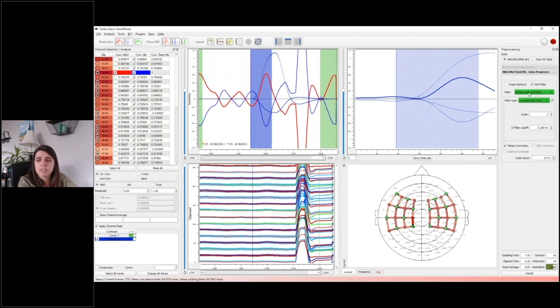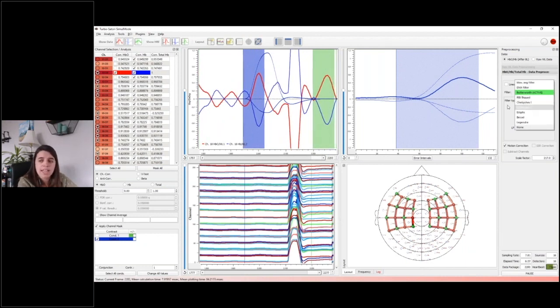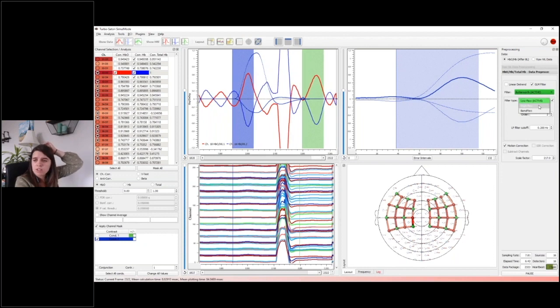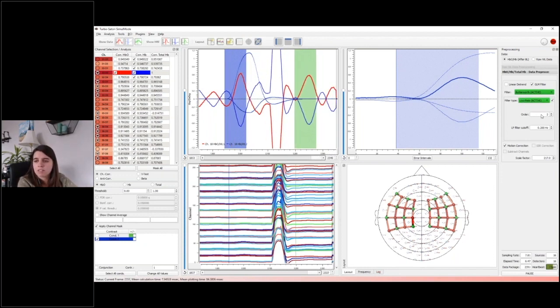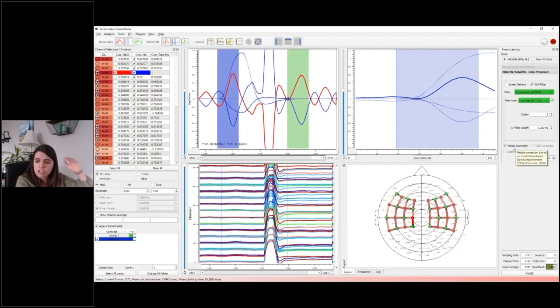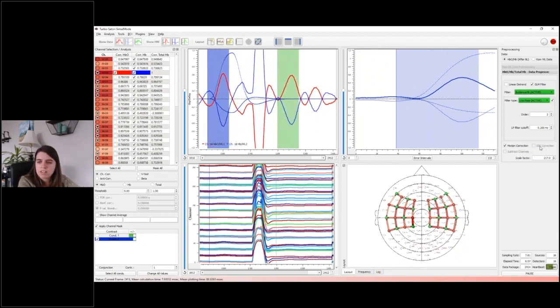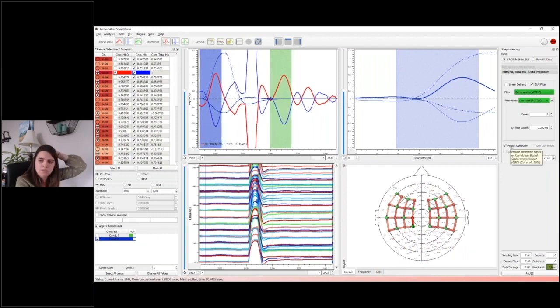Various filtering options. You can see Butterworth, Chebyshev, elliptic, and so on. And you can declare the type of filter you'd like to implement with this box down here. So we're applying a low pass filter, and we have the order and cutoff frequency here. We're also going to check off motion correction. So we're applying that CBSI algorithm. And note, a nice thing, if you hover over some of these boxes, it'll tell you the actual publication that's used for these algorithms. So that's a nice feature.